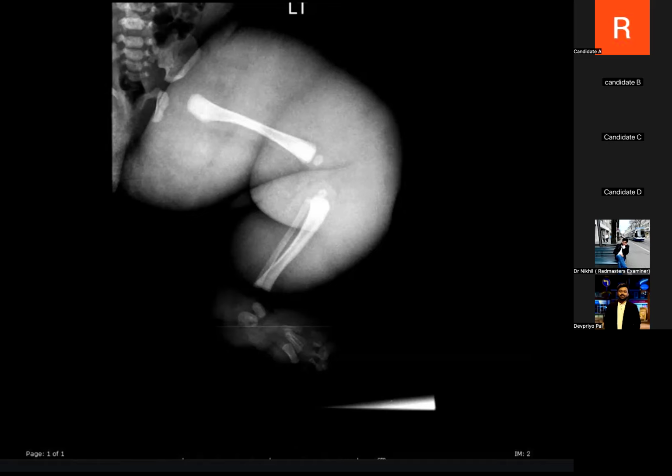If I tell you that this lesion is venous, retrospectively on an X-ray, what specifically would you look for if it's a long-standing venous malformation? I will look for phleboliths, but in this image, I already said I can't find any obvious calcification. But in my routine practice, I would like to zoom and look for phleboliths. Okay. So let's go with the MRI.